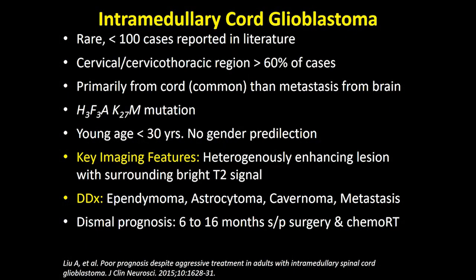So, certain features of cord glioblastoma, they are rare, they are associated with histone mutation, enhancement pattern is dirty, heterogeneous, it is associated with a very poor survival.